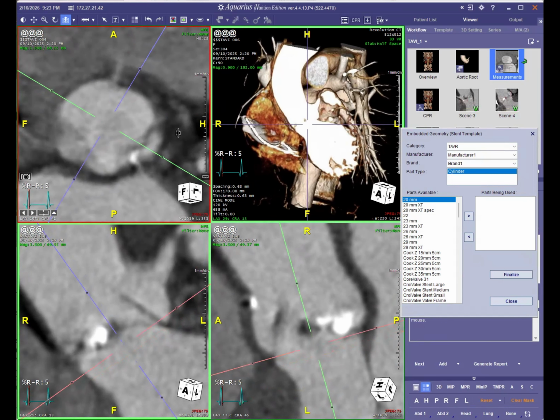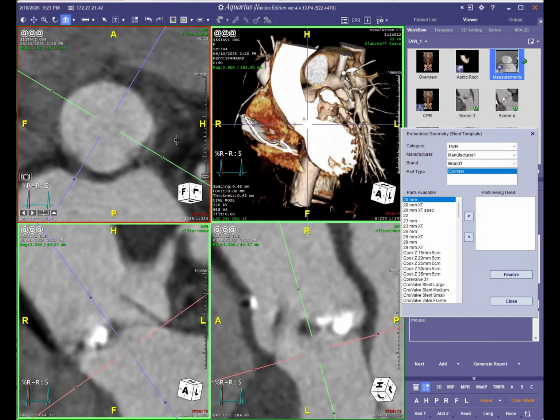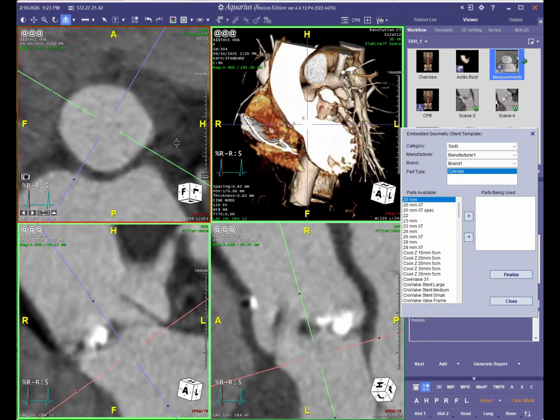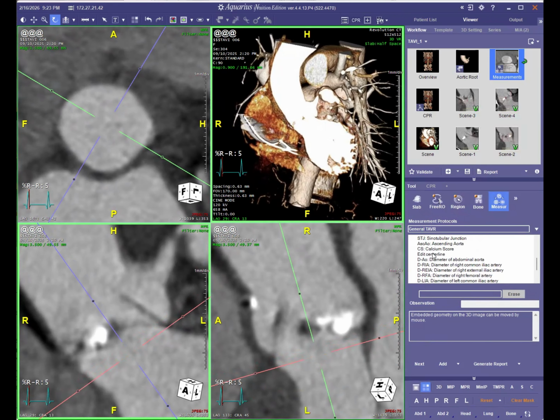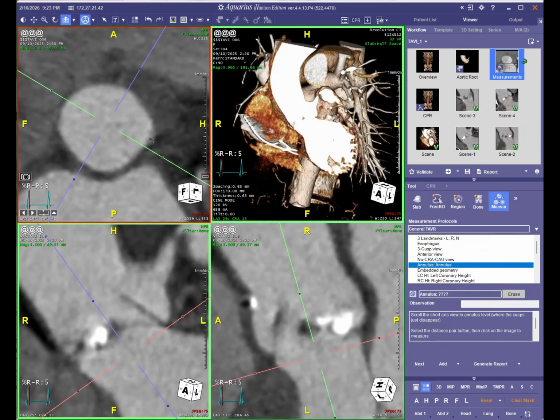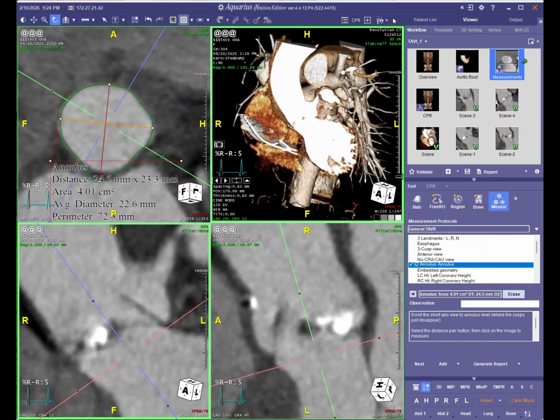I'm going to scroll up now and find the lowest nadir, and just as I lose that, I'm going to call that the coaxial annulus, if you will. I'm going to go over to my annulus tool over here, erase it here, and then restart to create that coaxial annulus and do some minor editing of that.